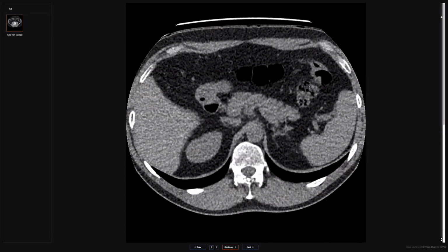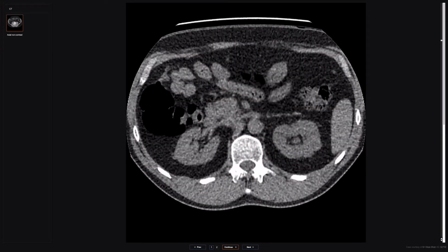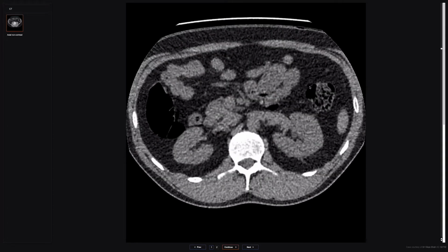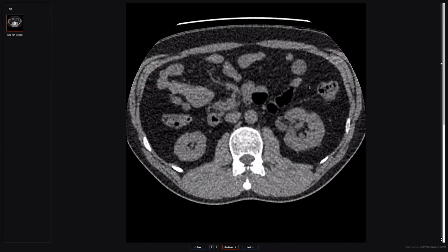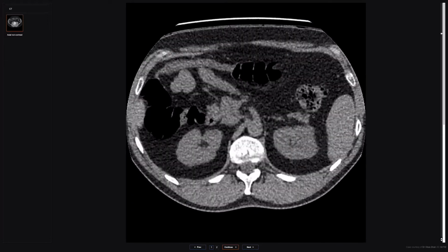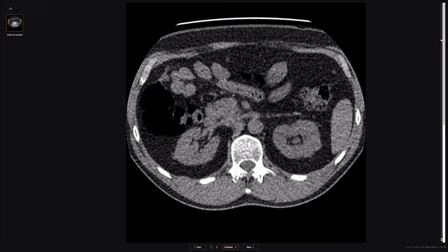And the reason we don't need contrast is because we're looking for the density of a renal, ureteric, or bladder stone, which you can see without intravenous contrast. And the sequelae, such as hydronephrosis or ureteric distension or perinephric fat stranding, you can see all of those as well without contrast. So from the top, I want you to get into the habit, when you scroll, of trying to look and see, right, hang on, can I detect from the beginning which kidney is abnormal?